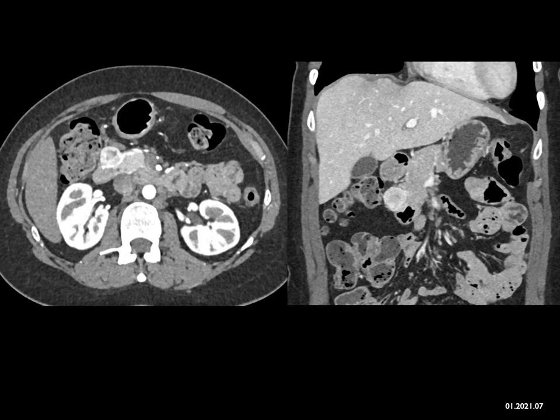Well, lymphomas can occur there, but they're typically infiltrating and not hypervascular. Carcinoid tumors can surely occur in the second portion of the duodenum, or even first portion, or even third portion, but they're typically intraluminal. Melanoma can metastasize, but they're usually hypovascular. GIST tumors are classic. Hypervascular lesions, duodenum's a wonderful location.